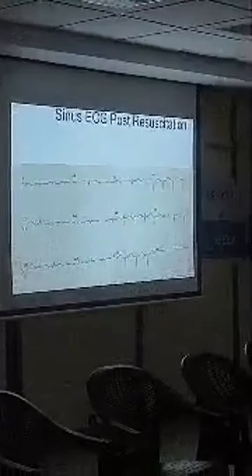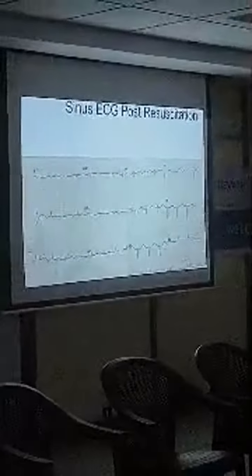Can you see there? In particular in this beat, after your QRS complex, the T wave is nearly gone, close to your P wave. Your QT is pretty long. Can you see here? The QT interval is pretty long. This is exactly what I was telling you.